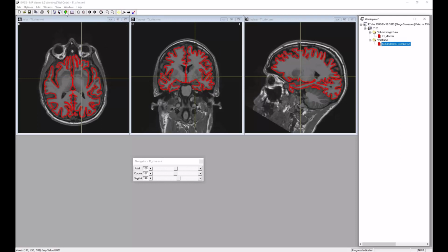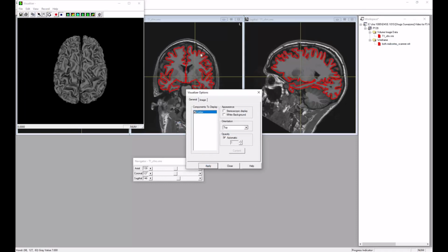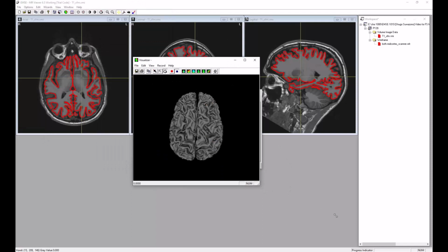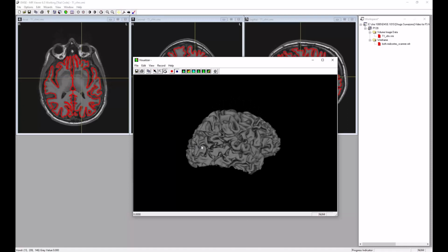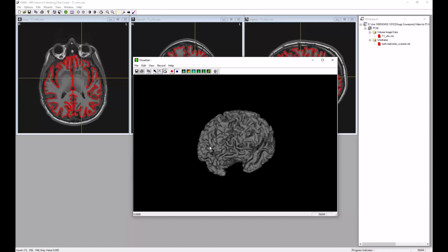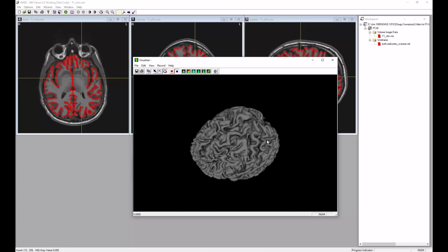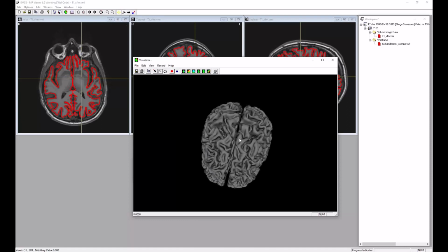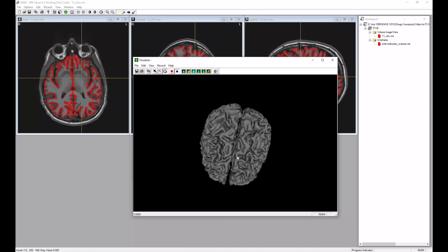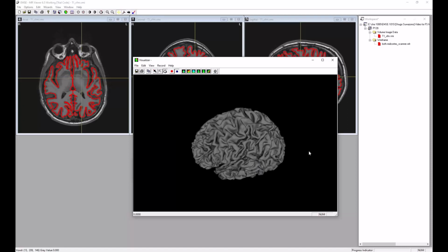So you can look at it also in the visualizer, and FreeSurfer does a nice job on the cortex. Once again, this is the midway, it's not all the way out to the pial surface, so we can see down into the sulci. And importantly, because FreeSurfer makes each hemisphere separately, we have the full medial surface of each hemisphere. They're buried down there, but we've got them.